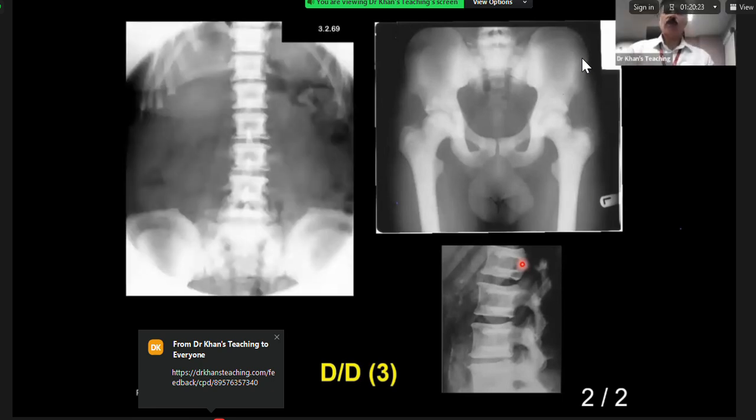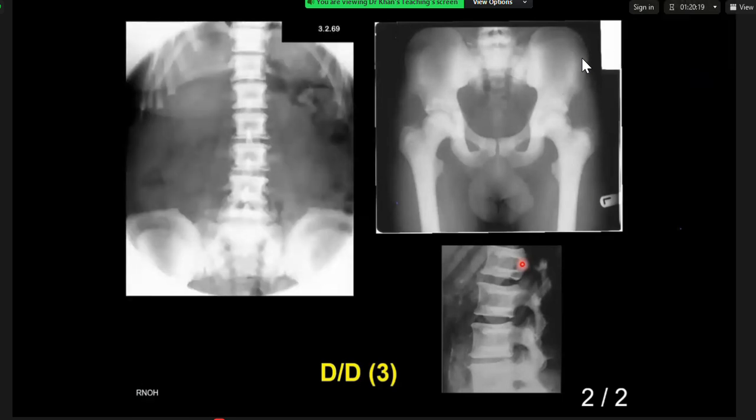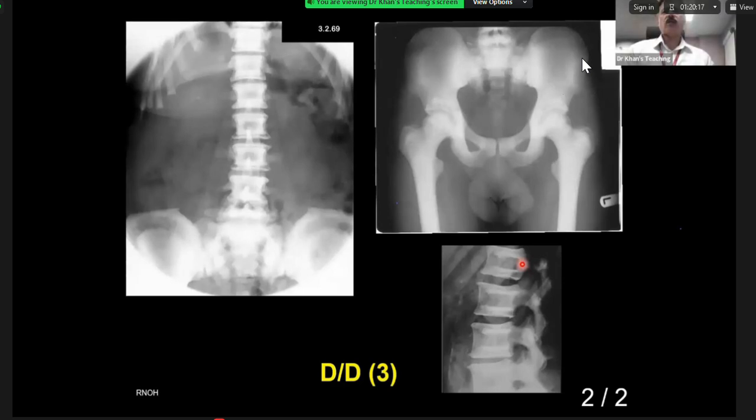Right. So let me take over. Basically, this is osteopetrosis, and why is it osteopetrosis? Please remember that osteopetrosis is what we call the sclerotic bony dysplasia of most significant magnitude, and it has a cyclic type of pattern.